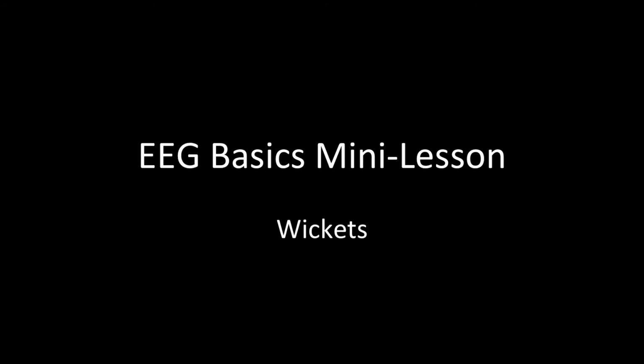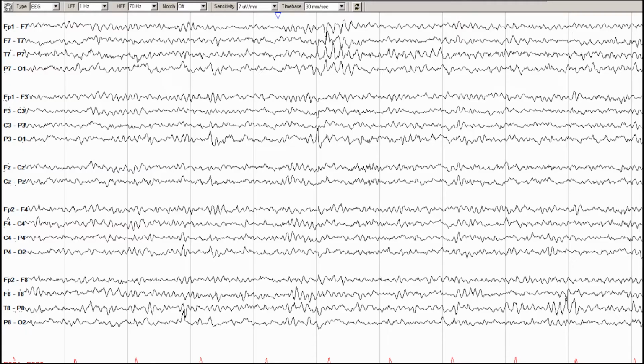This is an EEG Basics mini lesson focusing on wickets, sometimes known as wicket spikes. Wickets are a very common normal EEG variant, commonly mistaken for epileptiform discharges. It is important to distinguish wickets from epileptiform discharges so that you don't diagnose somebody with epilepsy who doesn't have it. Here is a screenshot of a normal EEG recording in somebody who is asleep.